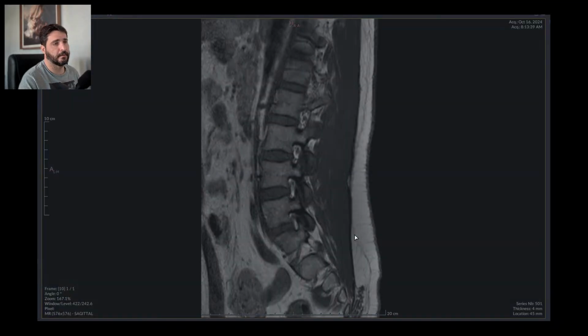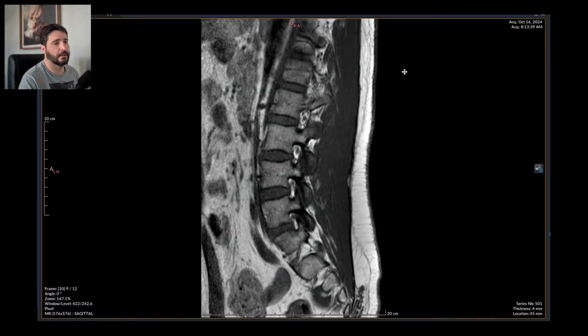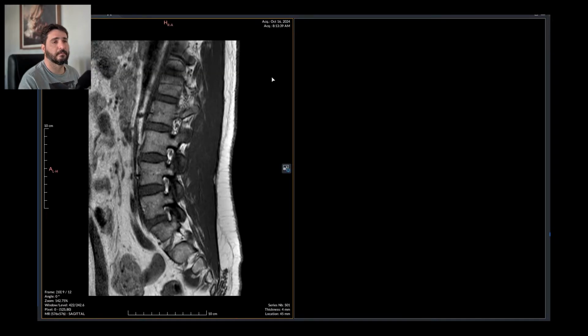No. Didn't seem to work. It says he has lumbar pain. He has lower back pain. I'm going to download once again his images and try to open. Now it worked. There is some error message here, but it's okay.